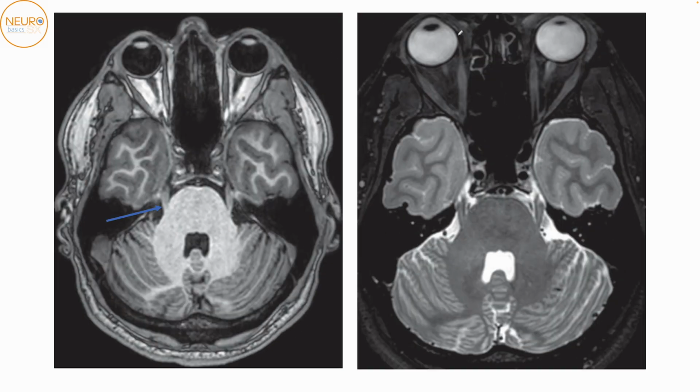When you come further down, you'll finally encounter the region of the Meckel's cave. Sometimes people can find it difficult to localize the Meckel's cave and the fifth nerve. The first thing is identify that you're at the level of the pons. Okay, make sure that you're seeing this bridge-shaped structure. Second thing, look just behind the cavernous sinus and just medial to the medial border of the temporal lobe. So right here, you'd find the Meckel's cave. Over here, we can see that the trigeminal nerve is running from the brainstem into the Meckel's cave.